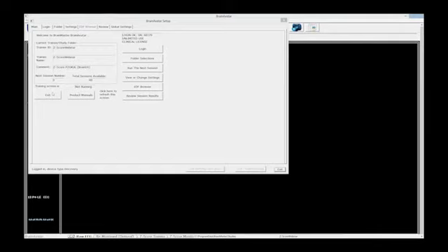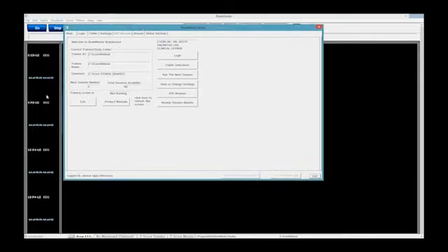So now that we know our difference between ZOK and ZOK-UL, I want to go through some abilities to change surface Z-scores and things like that, and where you change the settings. Right off the bat, the protocol is defaulted to do C3, P3, C4, P4. Not everybody wants to train those things. Some people have 19 channel Z-scores and want to train 19 channels. You have the ability to take this protocol and customize it for the patient that you're in. And it's actually really easy to do.